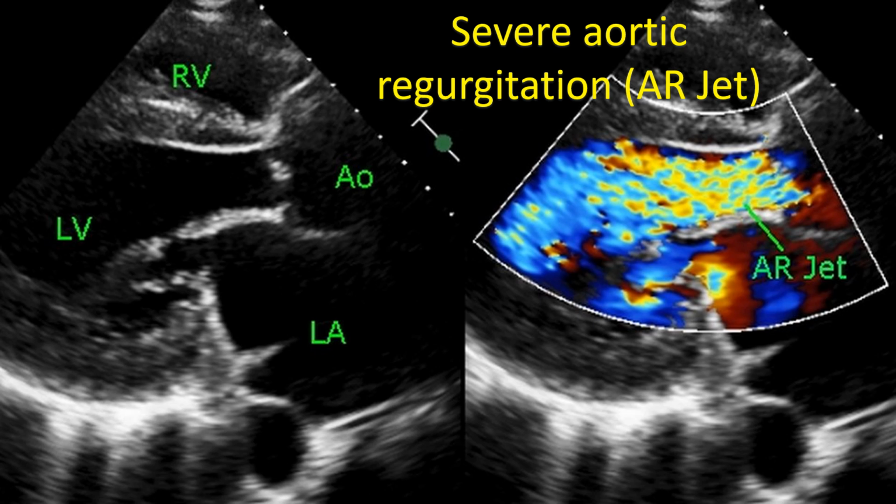The size of the regurgitant orifice can be assessed by the width of the mosaic jet on color Doppler at its origin between the valve leaflets. Sometimes a perforation in the valve leaflet may be causing the regurgitation. This can also be seen as a mosaic jet originating away from the region where the valve leaflets meet, in the belly or base of the valve.